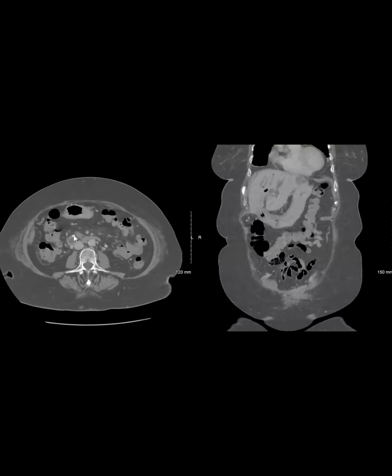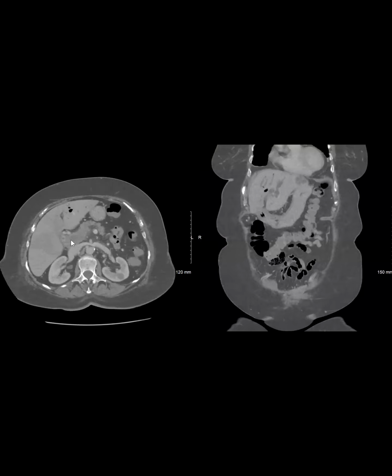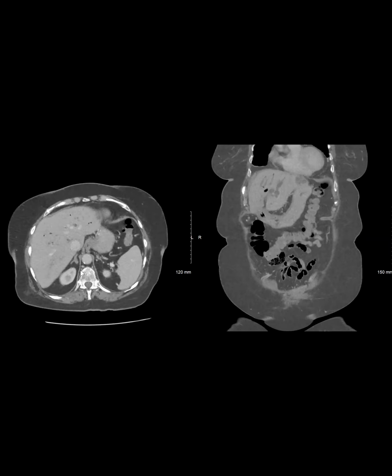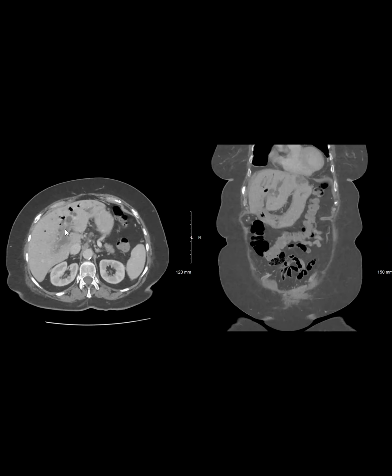Patient had ERCP and then developed cholangitis. You can see that there's actually air. Victoria, I can see that the images are a little bit not contrasty enough. Is anyone else seeing that? Yeah, that helps more. Thank you. Better. I think it's a screen setting, but it's fine.